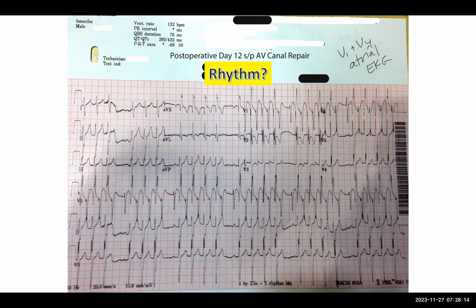So we're post-op day 12 with this arrhythmia. What would you do for this patient? Does this patient warrant a pacemaker? It's some kind of second-degree block. We think it's Mobitz 1, could be Mobitz 2, not sure. Probably Mobitz 1. And I might add, this question has no right answer, so I'm just asking your opinion. So this is a 5-month-old male, and the rate is around 130s with Mobitz 1 second-degree heart block.